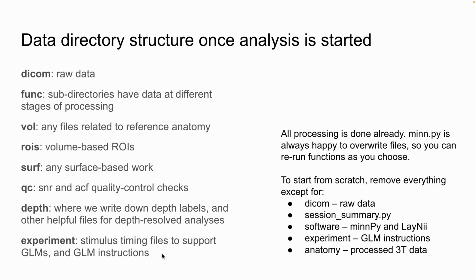And then there's an experiment directory where the raw behavioral data are stored with the DICOM, but the stimulus timing files that you need for your GLM and your GLM instructions are down in an experiment directory. So when you finally get access to this data set, it'll be all populated with all of these, and analyses will be done, if the rest of today goes well.